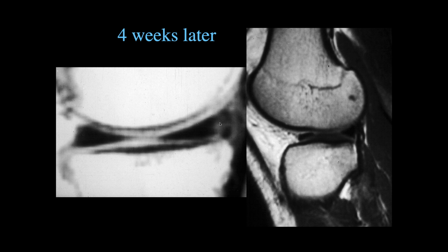John, if you look at the lateral, the sagittal view, there seems to be some dark area there, which could be a little bit of a depression? Right, that's what I think. Ash, you thought it was a depression in this area too. And yes, he had a little depressed fracture. I think it's healed, but I believe there is a little depression there.